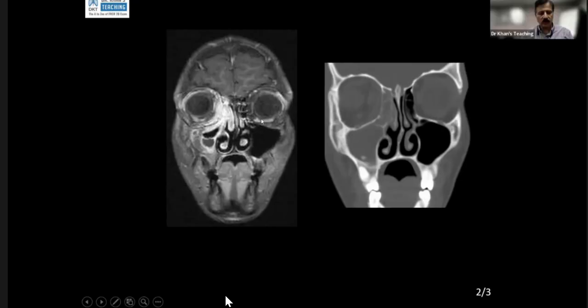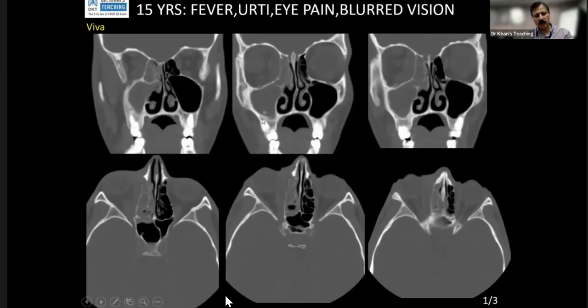Give me your diagnosis. Nasopharyngeal angiofibroma. So your anatomy is nasopharyngeal angiofibroma. We are at the level of the ethmoid sinus. So let me take over. Now, this is a classical exam case.